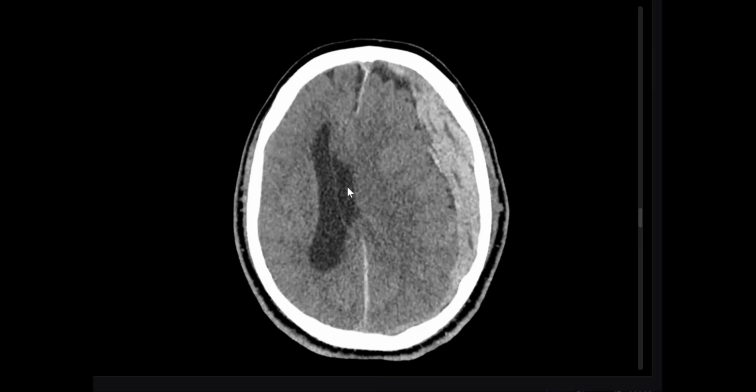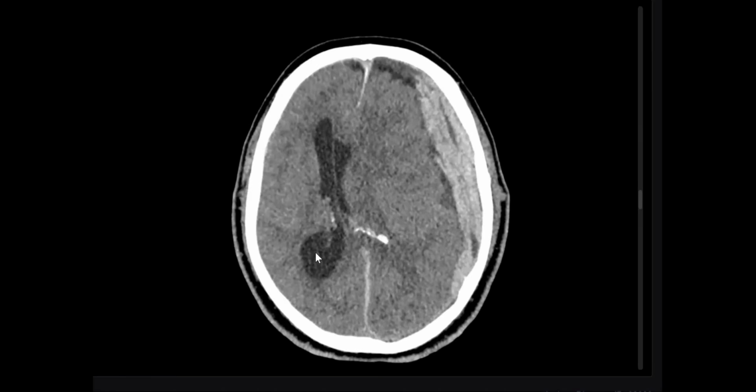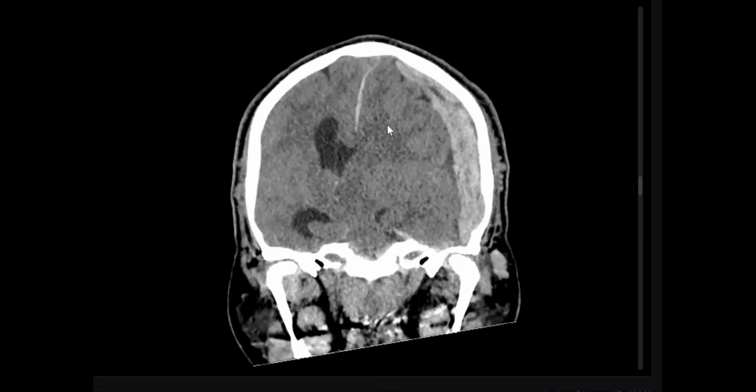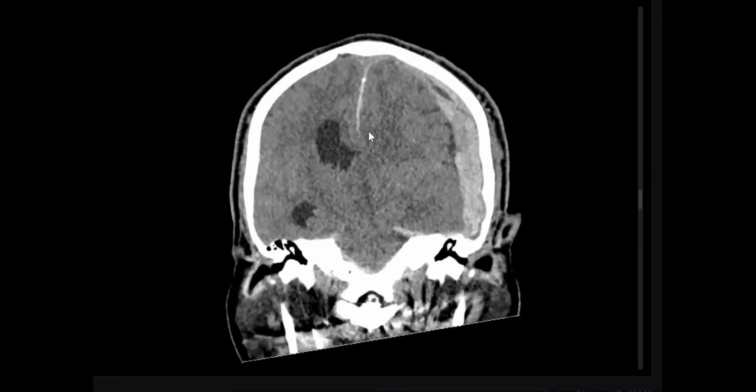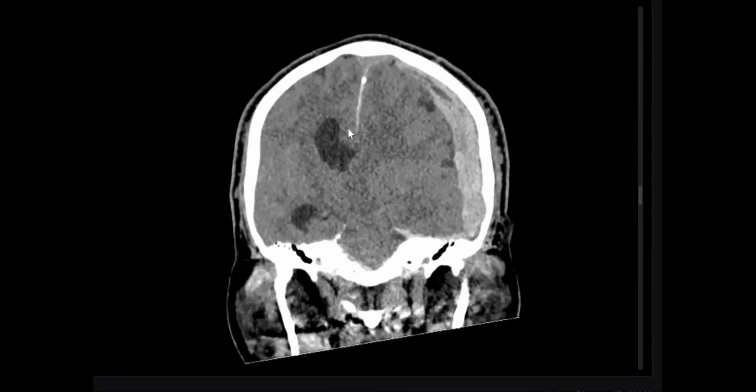Contralateral, if effacement of the ipsilateral ventricle and dilatation of the contralateral ventricle, it's a direct sign of subfalcine herniation. It's better to be assessed in a coronal, especially MRI, because of anatomical differentiation. Here, the cingulate gyrus will herniate. So it's called subfalcine or cingulate herniation, the commonest type of herniation.